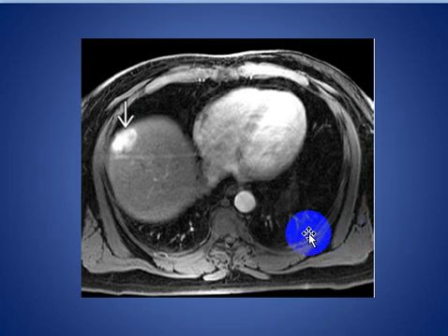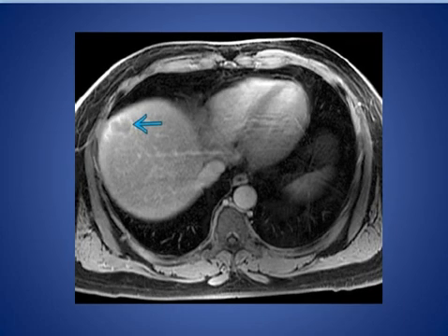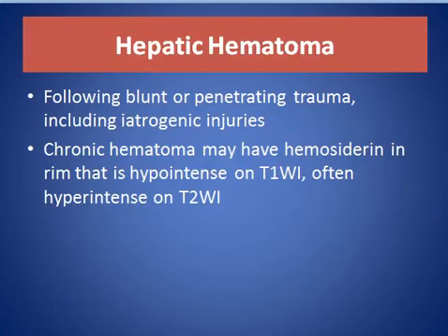Here, this is another patient with hepatocellular carcinoma, hypervascular on arterial phase, T1 weighted images. And this is the hepatocellular carcinoma of the same patient with washout on delayed phase, and you see the capsule on the delayed phase. It is still enhancing, and the center of the mass, it is washout in patient with the chronic liver disease.